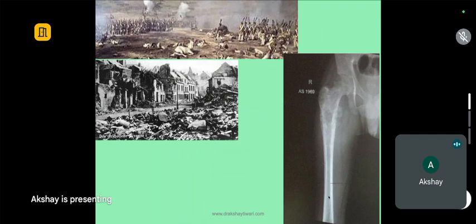Now here, if you start walking towards normal bone, you'll say, yes, I am sure this is normal bone. This is also normal bone. Then someone will say probably something has started here, or someone will say here, or maybe here. So where do you have a tumor that is definitely tumor? Here, here, but then there'll be areas which again are not so clear. So this is a very aggressive tumor, an ill-defined margin, and this is a permeative kind of a lesion, right?